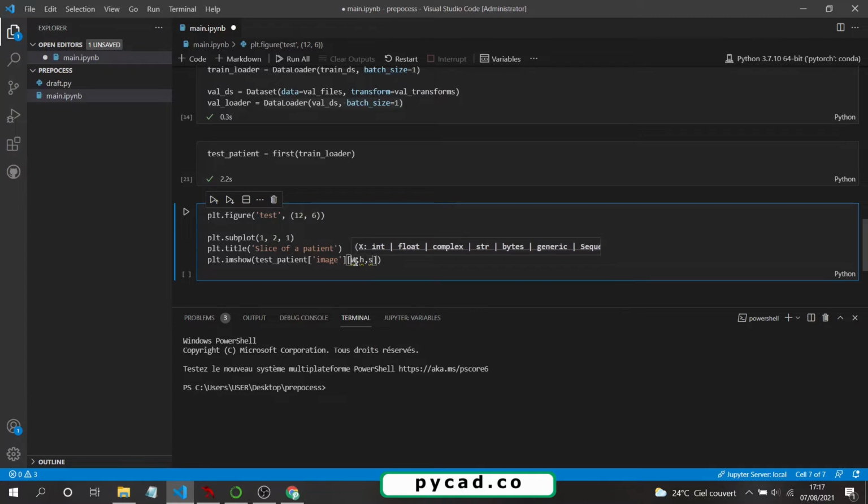But as we said, we added another dimension which is for the batch size, so we can call it, for example, B for batch size, like this. So here we have the batch size, the width, the height, and the slice. But in our case, we are doing image segmentation. So if we have only two classes like background and foreground, which is the tumor, here we need to define which slice we are talking about, which channel we are talking about. We are talking about the foreground or the background. We say that here we are talking about the image.